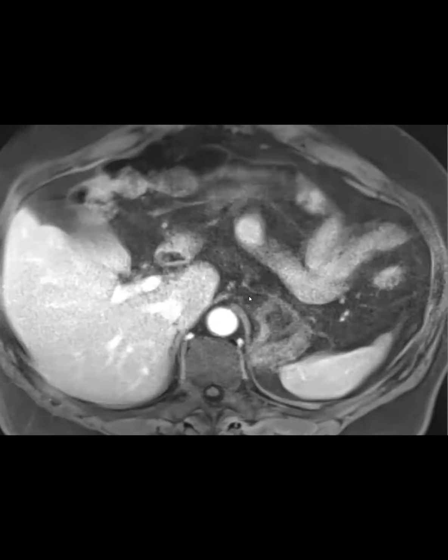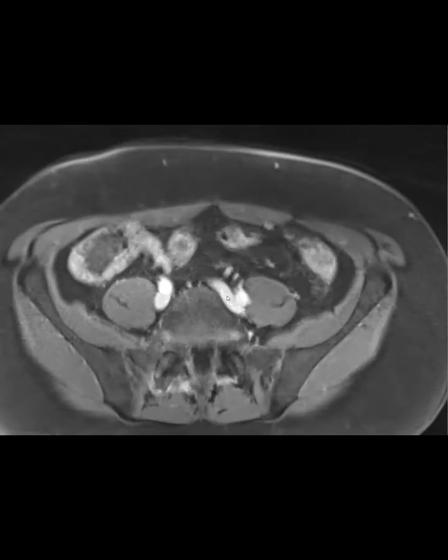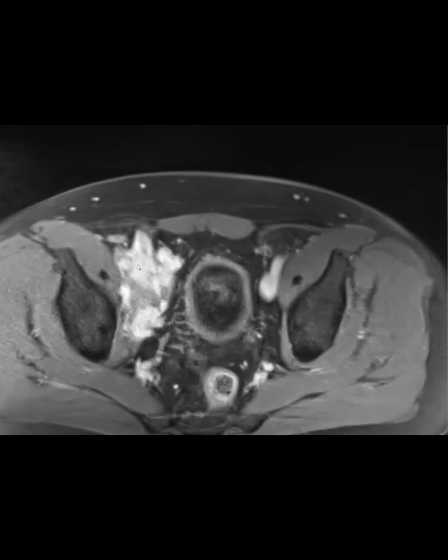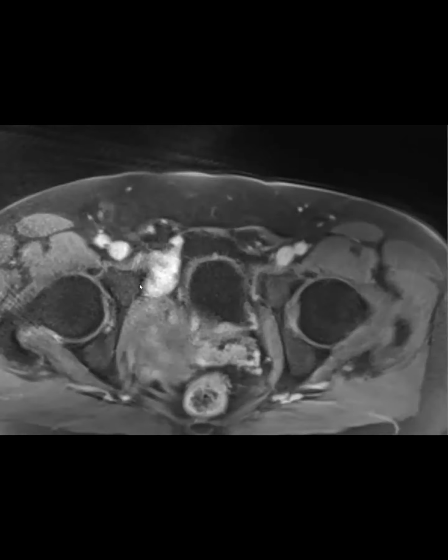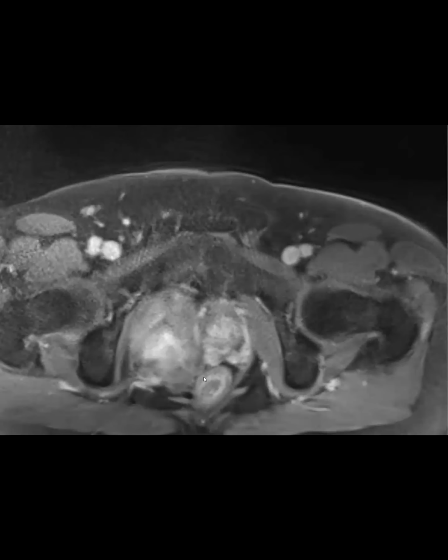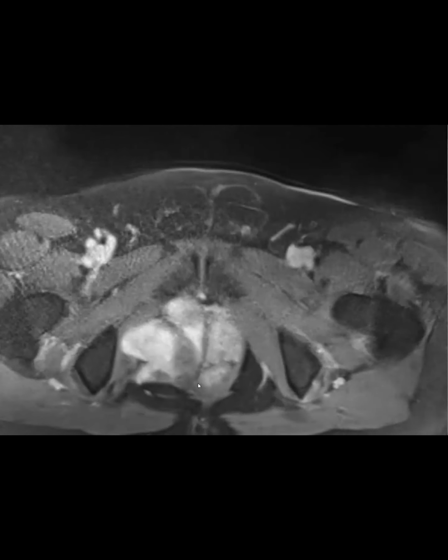This other one, you saw that it's in a really tricky spot. It was in the pelvis. This big enhancing mass here is obliterating the external iliac vein and encasing the external iliac artery. It was inseparable. It was abutting the prostate and the rectum.